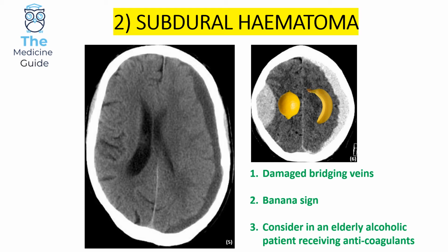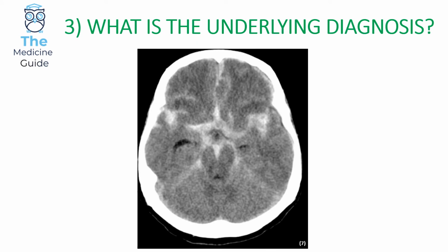Okay, let's have a look at the next image. So this is number 3. I'll give you a little bit longer for this because this one's a bit trickier. I'll give you 20 seconds for this one. Okay, let's find out the answer.